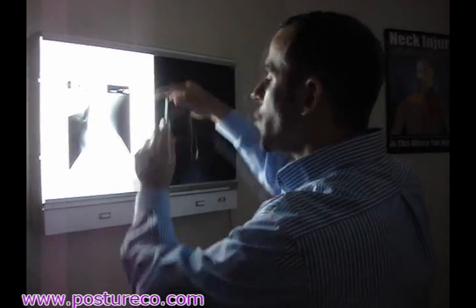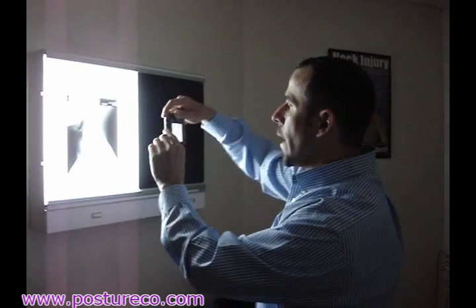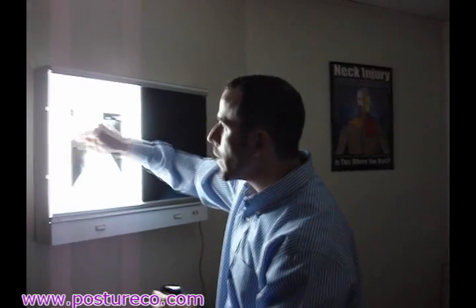Also, one of the things that you want to make sure you do is have the zoom about halfway out, if possible. When you take a picture and look back on your computer, if you see what's called a fisheye effect, a bowing of the squareness of your X-rays, that means you have a problem with your camera setup.